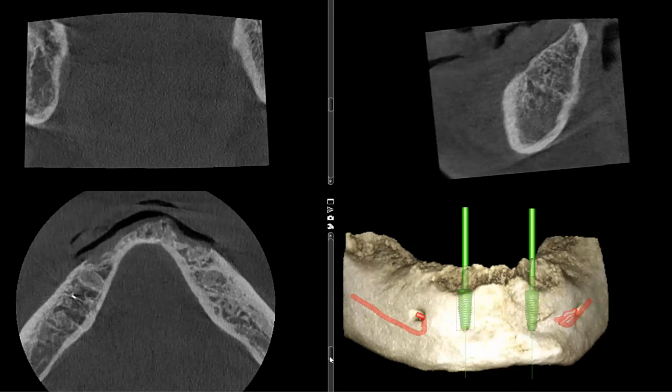Endodontic material or even just fragments of dental materials that may have fallen into the extraction socket. So that didn't really concern me, and I really didn't see anything that caught my eyes in the axial plane until I saw the coronal plane.